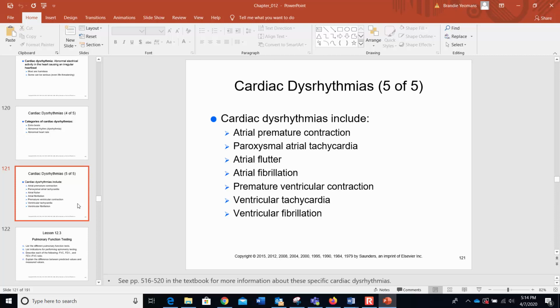So, the biggest thing you see here is that there's going to be more than one P wave that precedes the QRS complex. Remember, precedes means it comes before, and that P wave is going to look kind of like a sawtooth spike between those QRS complexes. Okay, so that looks kind of weird. Now, what else you might remember is that the QRS complexes of atrial flutter kind of are normal, but the T wave is one that's normally lost. So the P wave looks different and it's sometimes lost.